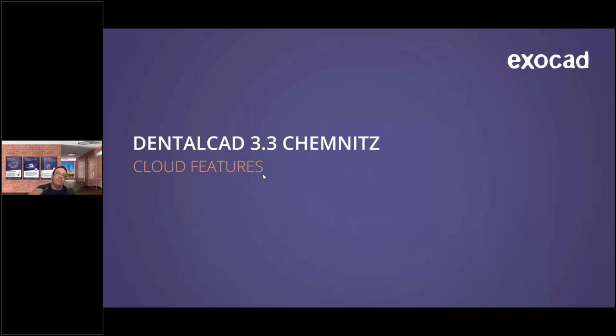All right, so for today's webinar, we're going to go through some slides about the new features and talk about a lot of the new stuff that's in there, and then we're going to go through a few cases afterwards and live demo some of the key features of the software. Like I said, this is an introduction webinar, so not everything that's new in the software is covered here, just the key features that we picked out that are probably some of the most important goodies in this version.